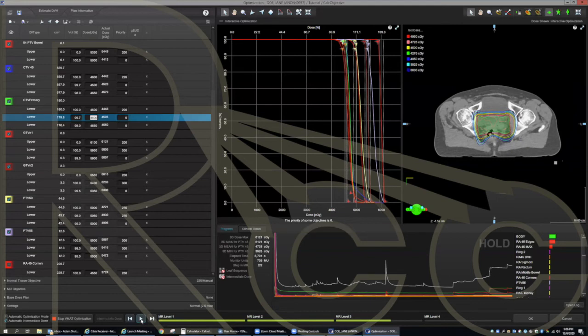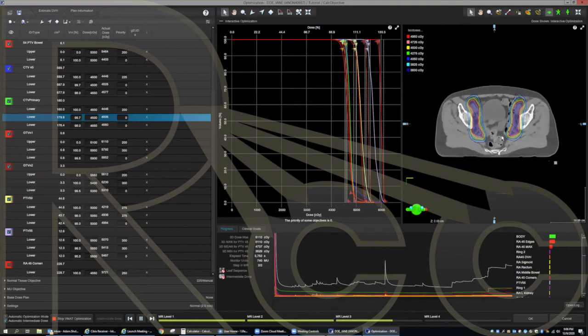Okay, this is leveled off. So we'll move finally into step 4. And again, guys, I've got a year of rust on my planning skills. You're good, actually.